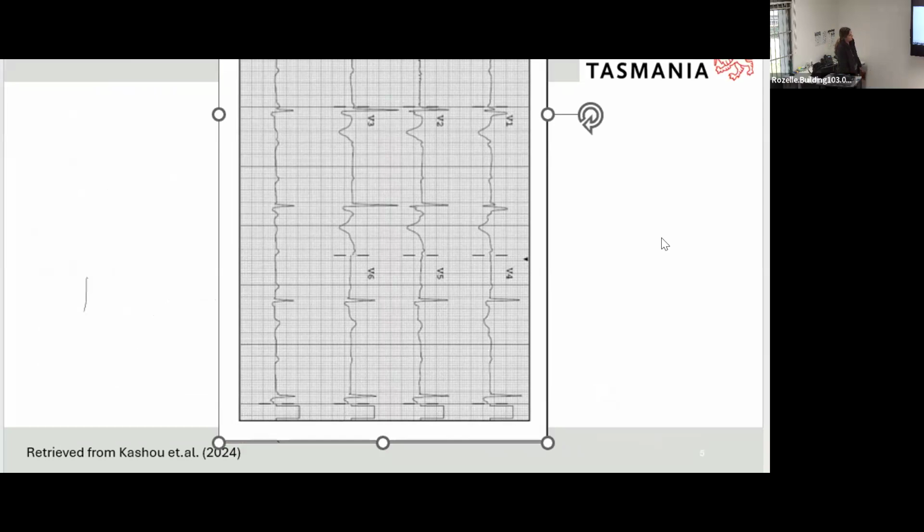If the QRS complex is mostly pointing to the right, then you can see that that's the right bundle. And if it was mostly down here in V6, it would be pointing to the left, and then you would be suspicious of left bundle.